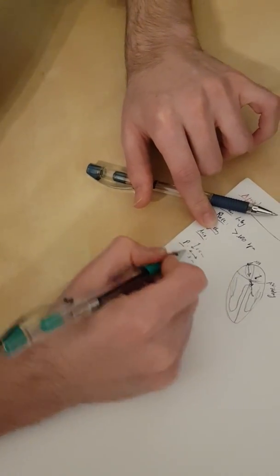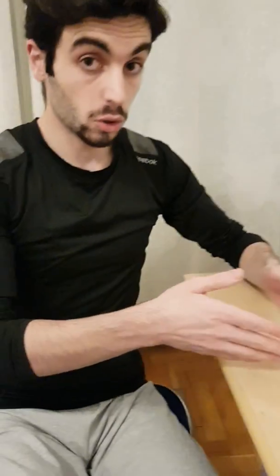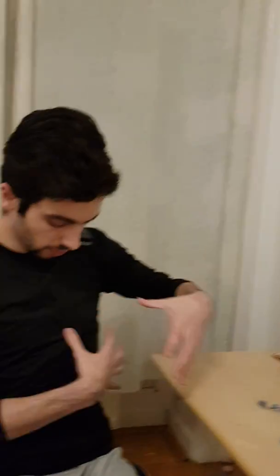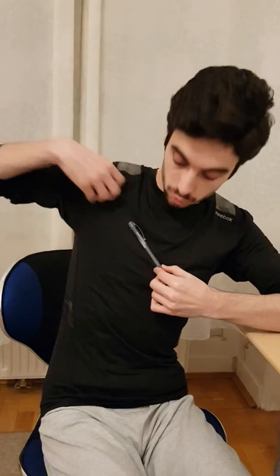And the morphology of the P wave is that it should be positive in all leads. Why is that? Because all the leads, whether it's lead 2, AVF, 3, 1, AVL, all of them should be positive, because the P wave goes something like this, except AVR, which goes all the way that way. So it's negative in AVR and positive in all the leads, and biphasic in lead V1. Why is that?